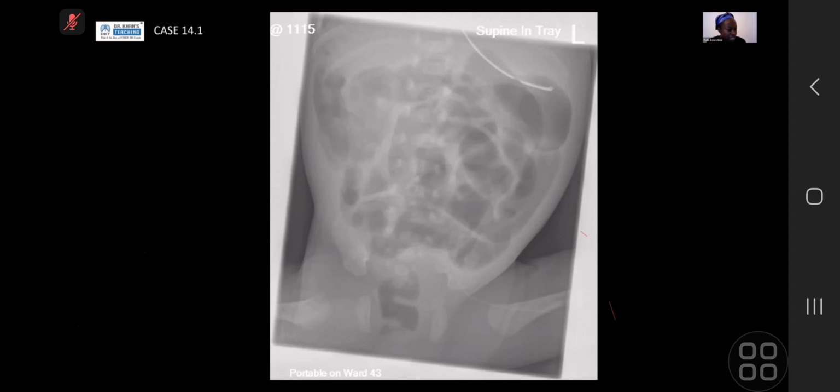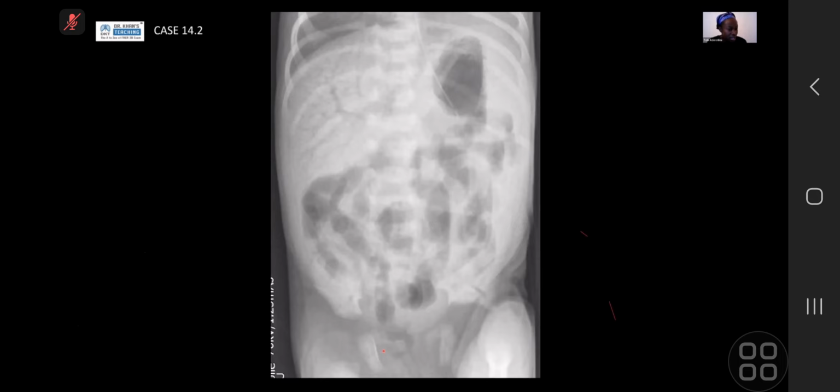So speaking of typical findings and things that demonstrate NEC, we can see here, as candidate 3 described, you have linear branching lucencies over the liver shadow, and they reach to the capsule of the liver, all the way out to the periphery, and this is in keeping with portal venous gas. If this was biliary gas, it wouldn't reach all the way out to the periphery. It'd stay more central. So that's how you can differentiate between the two.